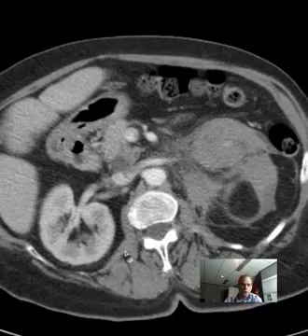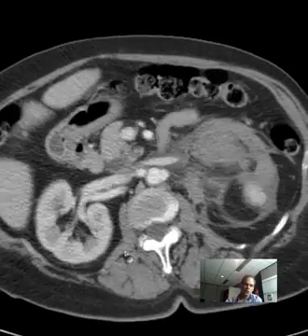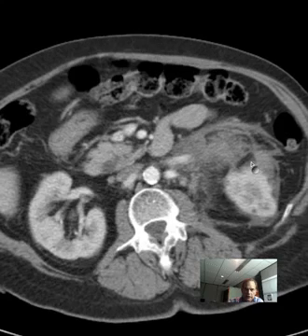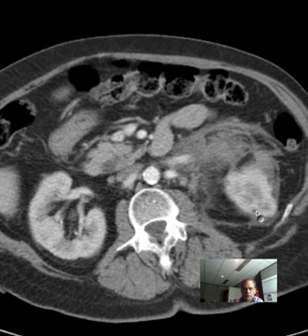Well, if we go up, we're going upward here. Is the kidney the problem? Is this a renal process or something else? It doesn't look like the kidney itself is really in bad shape. It has some of this stuff around it, but the margin of the kidney looks okay. I don't see a renal mass. Tiny little sub-centimeter cysts. What's defined here is the perirenal fascia, and you see it thin and normal here, so whatever's going on here is infiltrating the perirenal fascia.